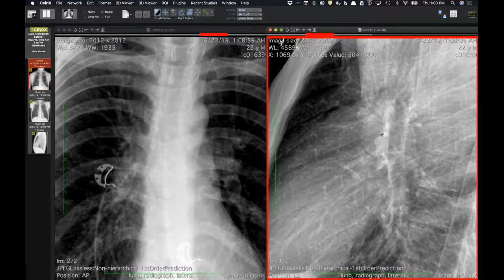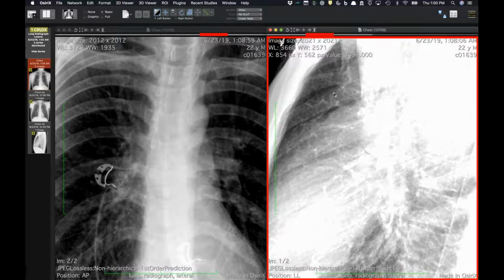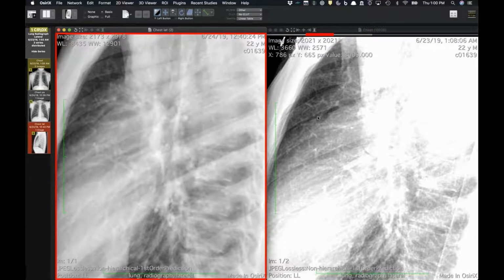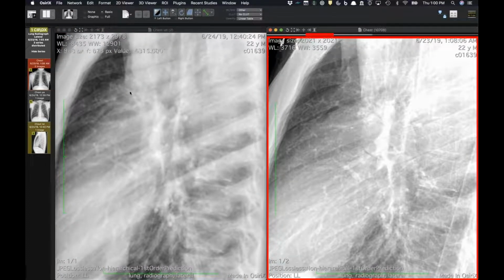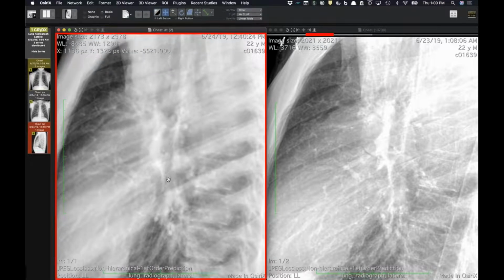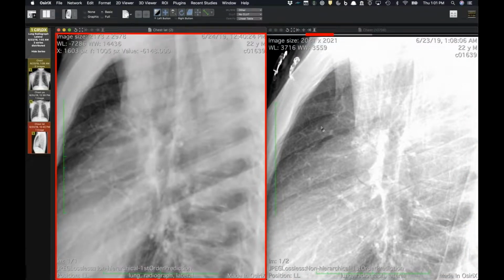Yeah, it's a combination of ring around the artery and a bit of a ring around the pulmonary vein, which obviously crosses the right pulmonary artery on its way to probably a little along the ascending aorta here. Yeah, that one's a little harder to see. I think so, though. Because you just see the ascending aorta too well, and then I don't know if this is probably just vessel rather than along the main pulmonary artery, but I don't know. So very nice. But a good eye test and a good pickup.